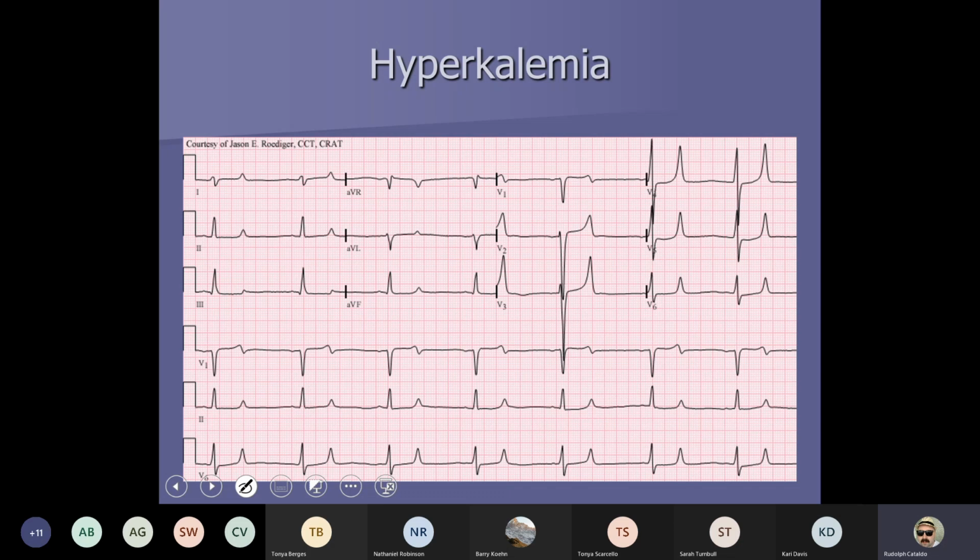Remember how I taught you guys at one time the difference between a hyperacute T wave, how a hyperacute T wave precipitates a MI, and it's big and rounded. Well, a hyperkalemic T wave is pointy at the end and tall. That's how you differentiate the two. If I look at lead 2, like down there at the bottom, see how tall my T waves are and see how they're pointy? That's hyperkalemia. And this can be an imposter of a STEMI.